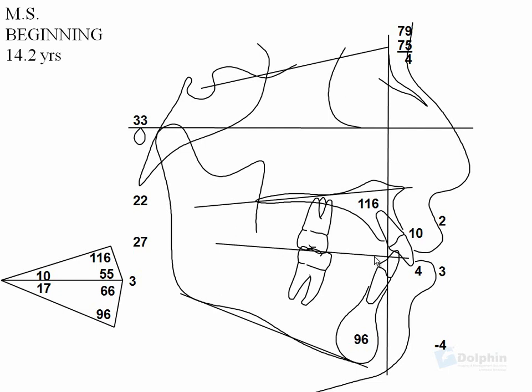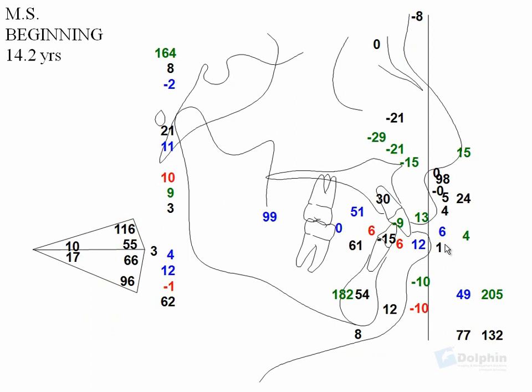This is his traditional cephalometric tracing, which is based on cranial base landmarks. This cephalometric provides us good skeletal and dental information. The next tracing is an excellent addition to the traditional cephalometrics. This is the Arnett analysis.